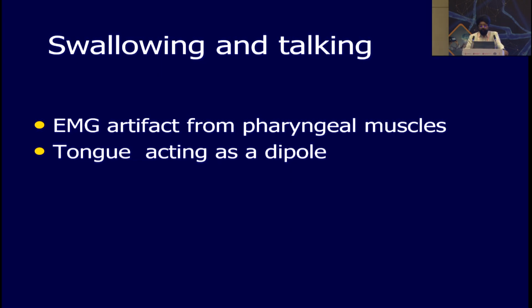Swallowing and talking can also cause EMG artifacts from the pharyngeal muscles because the tongue is acting as a dipole.